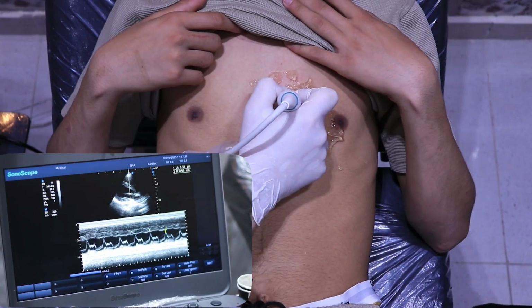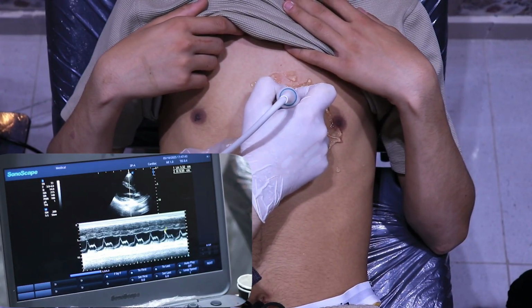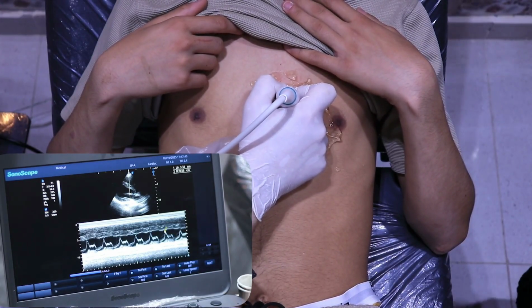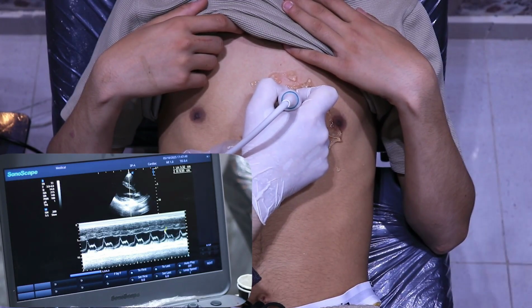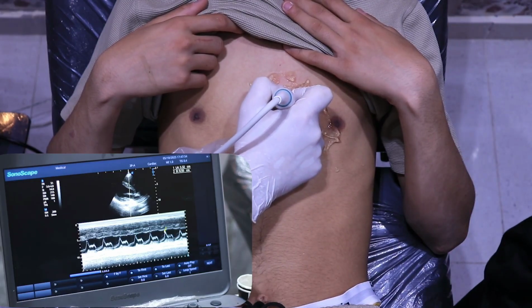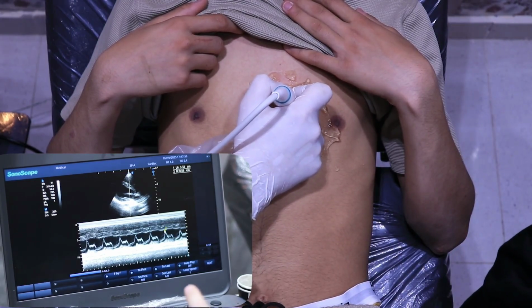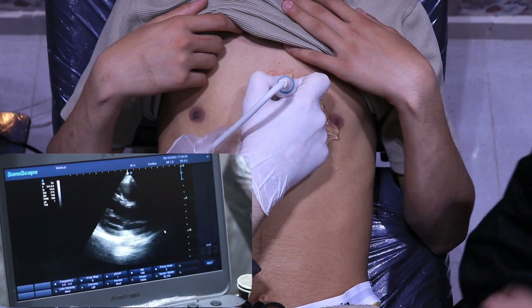If it increases, it means there is a reduction in the systolic function. So the heart is not able to open the mitral valve. That means that the mitral valve is not being pulled toward the left ventricle due to either left ventricular systolic or diastolic dysfunction. Okay? Doctor, are all causes of its increase related to systolic function, or could there be other causes related to the mitral valve?